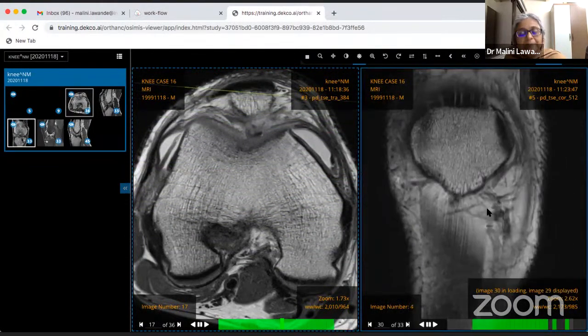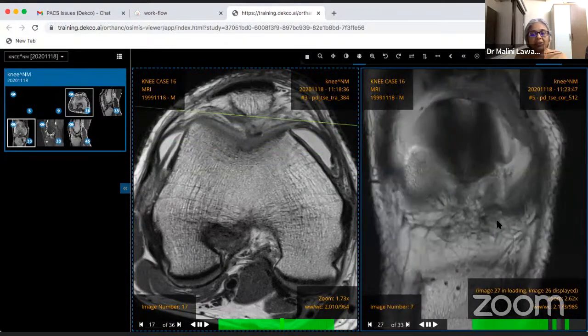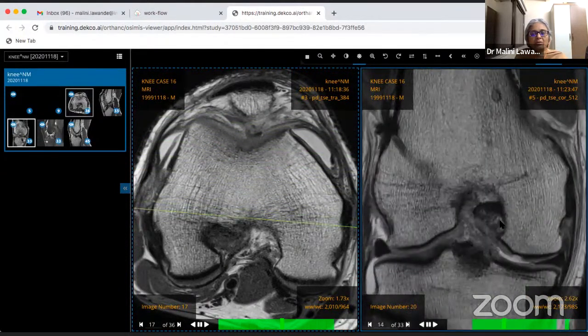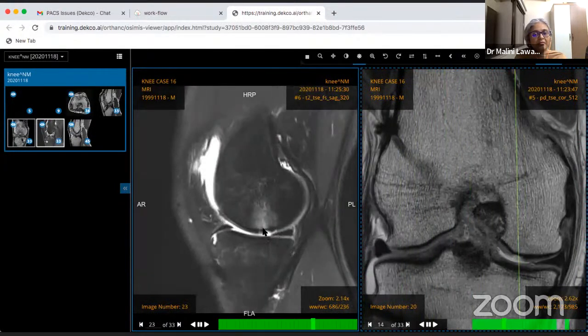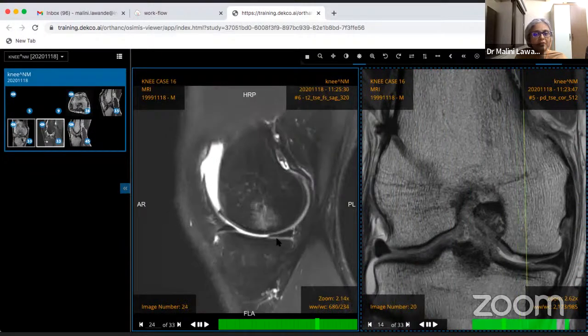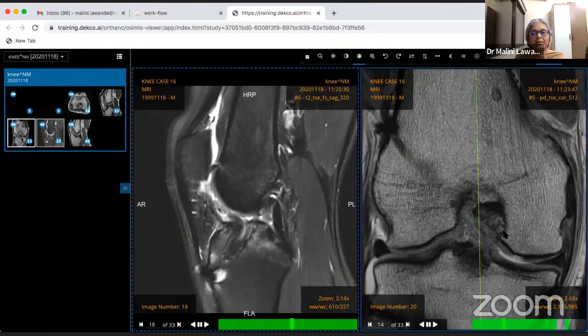So in this patient, there is a mild lateral femorotibial translational marrow edema pattern, high-grade mid-substance ACL graft injury. There is a full thickness cartilage defect. We give measurement. So something maybe about 3 millimeter transverse and 5 millimeter AP, full thickness, central weight-bearing medial femoral chondral defect with moderate underlying marrow edema. PCL is intact.